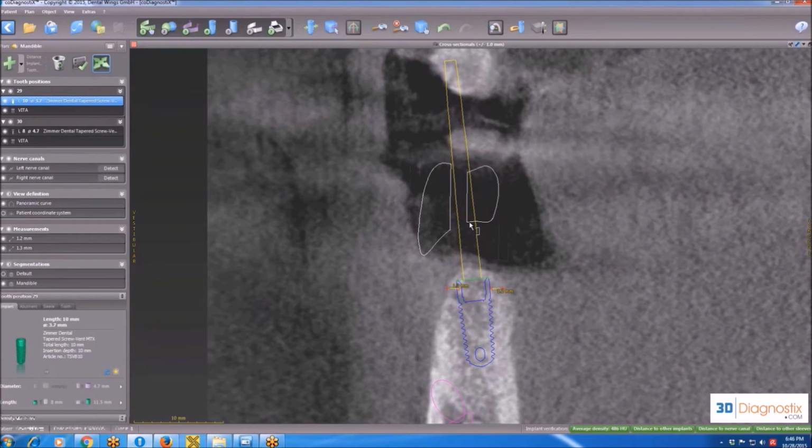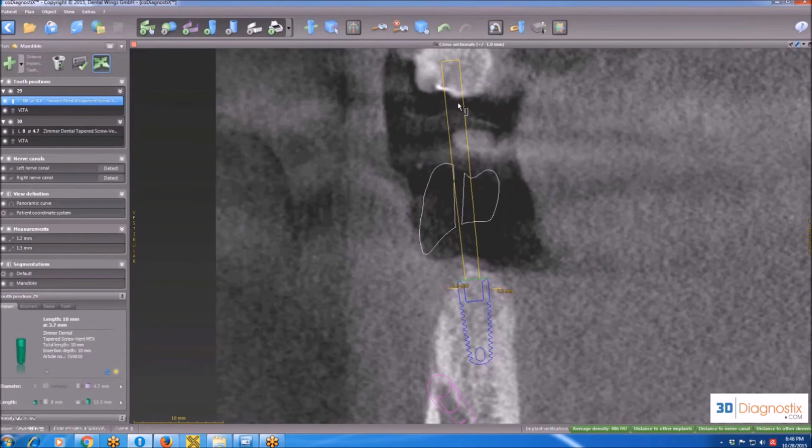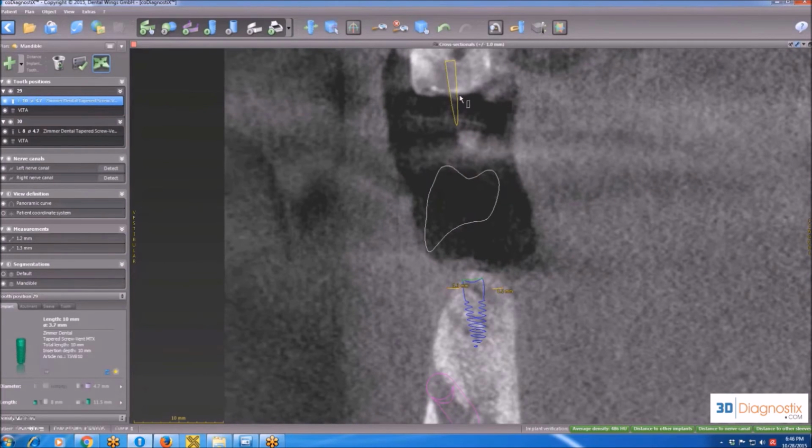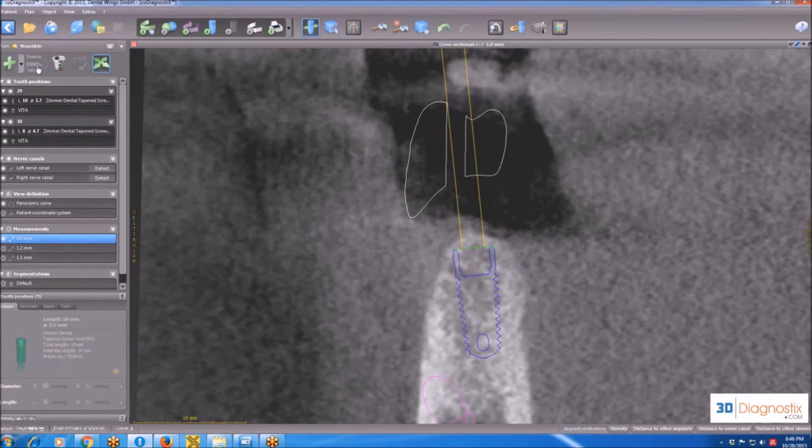Right now, we are emerging from the center of the virtual crown. I'm satisfied with that position. Let's try to measure our new buccal bone. Again, click on Distance. Choose Points over here.